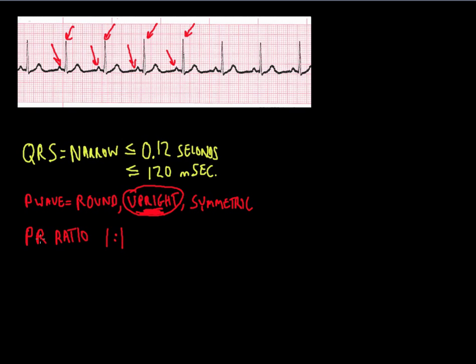Now the next one that we're going to do, I'm going to jump over here and switch colors for. We're going to use the blue. So on this one, it's a PR interval.